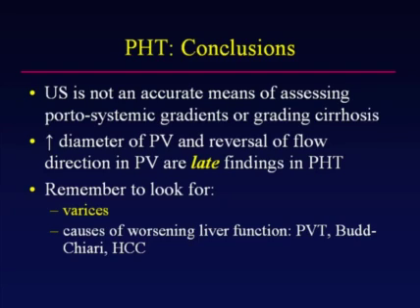When you evaluate your patient with portal hypertension or suspicion of portal hypertension, in addition to the Doppler exam, remember to look for varices and to look for causes of worsening liver function, namely portal vein thrombosis, Budd-Chiari syndrome, or hepatic vein thrombosis, as well as tumor, most commonly hepatocellular carcinoma.